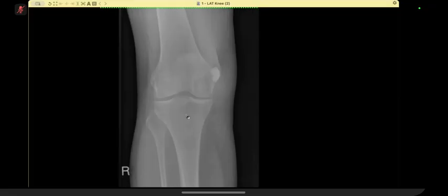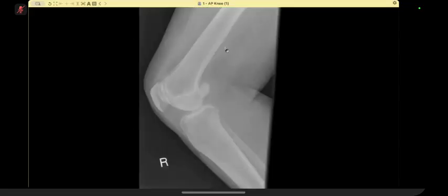In my routine practice, I will adjust the windows to make the visibility a bit clearer. I would also evaluate the patient on the other orthogonal views. I'll also evaluate this calcific density on orthogonal views to check.